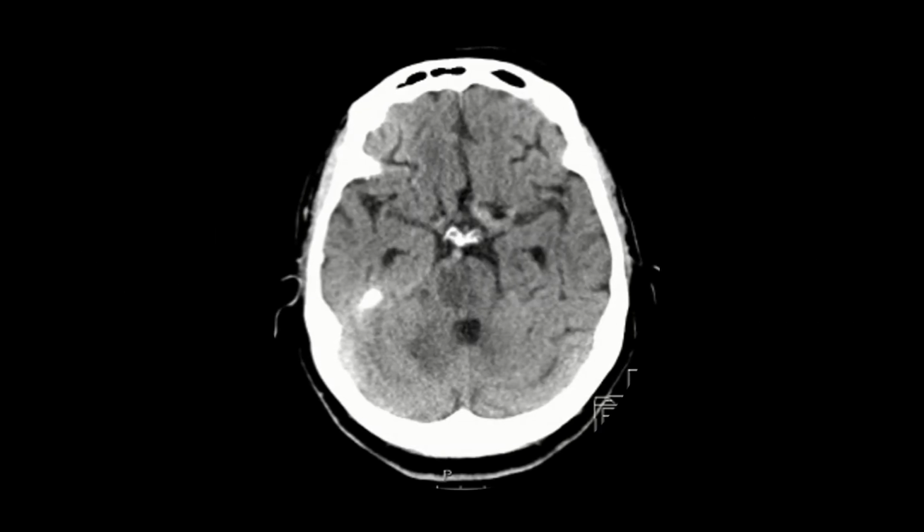Right, so into the posterior fossa structures, we have the brainstem and the cerebellum, the brainstem in front, and particularly in this region we have the pons. And back here we have the cerebellum. So always remember that CT does not give you a high definition of soft tissue structures. So if it is the brainstem or the cerebellum, it's always MRI, MRI, MRI.